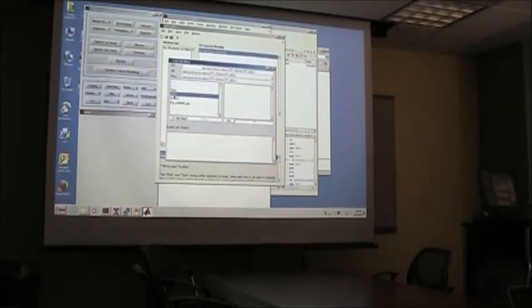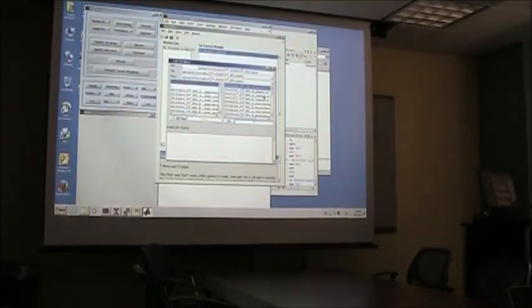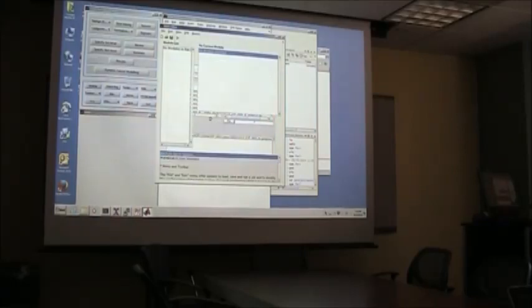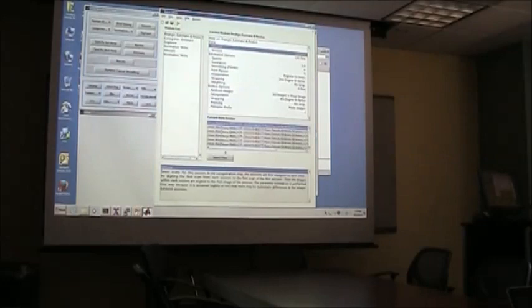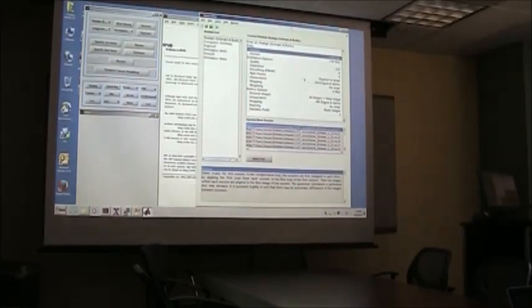Let me see if I can find an example. This is how it will look in SPM.